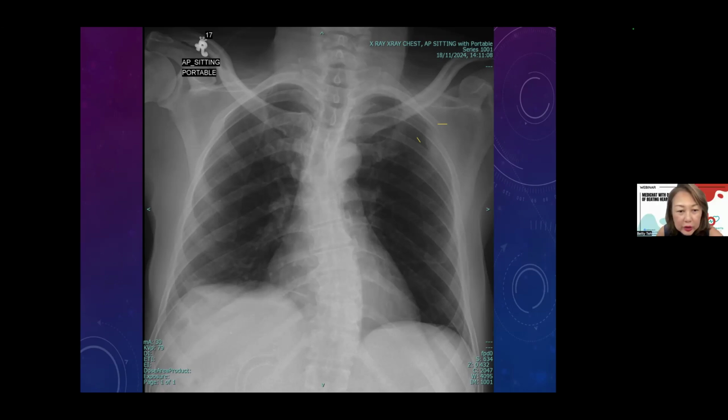Carina. Okay, Shafika said left lower lobe collapse. No, I don't think so. In a lower lobe collapse, you will see a sharp triangular line with opacity here at the retrocardiac region. This retrocardiac region is fairly clear in this patient, so it's not collapse. There's no collapse in this case. Now the lung I've already gone through. I'm going to look at the bones now.